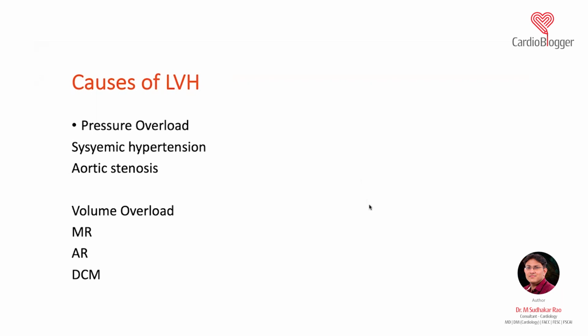But it is very easy to miss left atrial enlargement on ECG. Similarly, it is not very difficult to pick up right ventricular hypertrophy and right atrial enlargement on ECG, because there will be some soft clues or markers to their presence. Plus, left atrial enlargement is something you should always keep in mind, because many times in clinics patients present with dyspnea, and the ECG shows nothing but left atrial enlargement. You should always suspect diseases like mitral stenosis if the patient is not hypertensive.